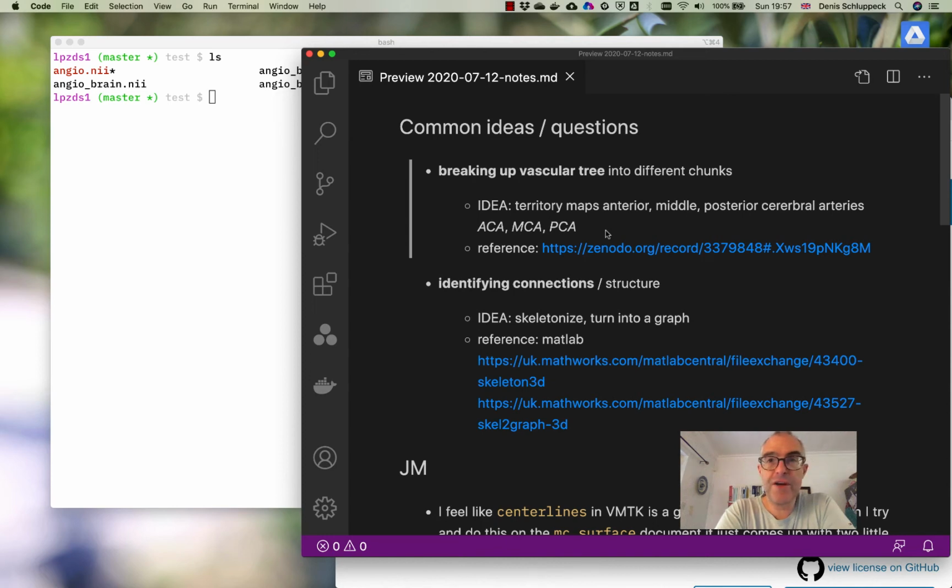So this is video number 5 in this series on analyzing the MR angiogram data from the MSc project that this team is working on. In this video, I want to tackle 2 different sets of ideas that are going to be quite useful no matter what specific question you're interested in.